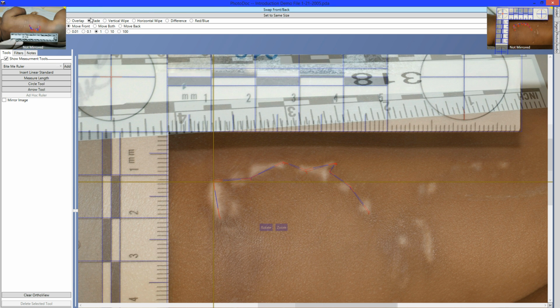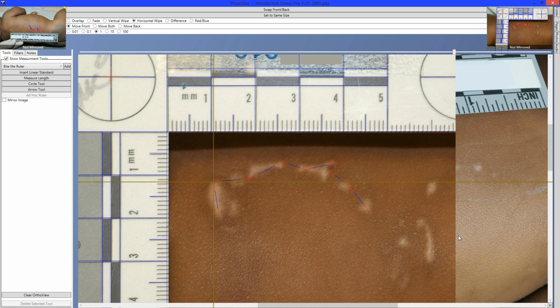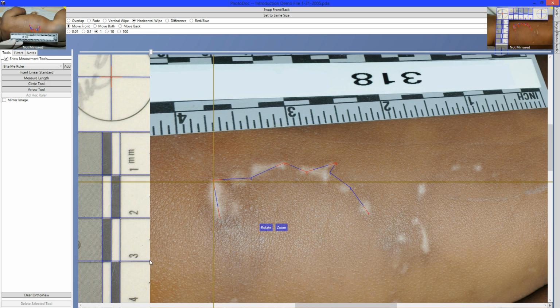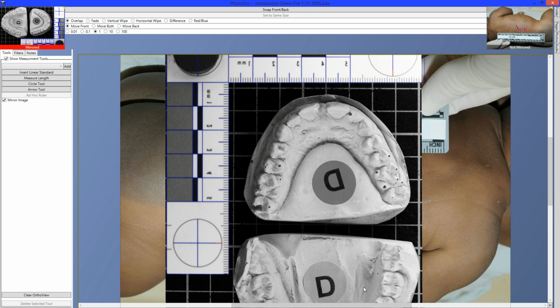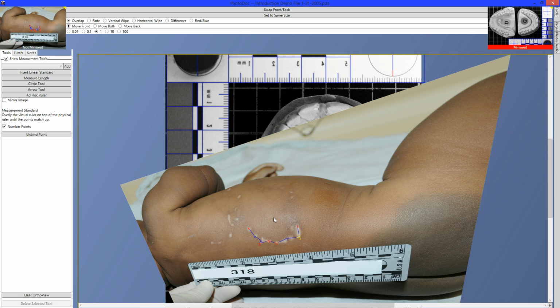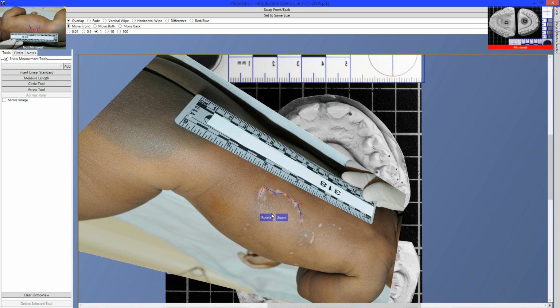And what we find out is that we've got a fairly good match, which is pretty good for one of them not having a ruler. But this thing now works exactly like a ruler. So when I go back to this problem, I now have a ruler to play with. I go like this. I select this as the ortho view. Rotate it like so.